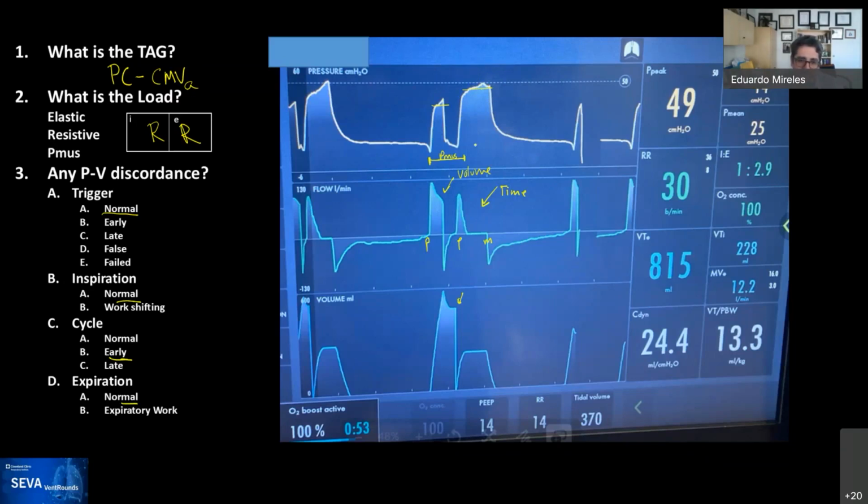Rob? There's nothing about this documented in the manual that I can find. And the only other thing is the way you know that this is adaptive targeting is because there's a set tidal volume at the bottom.